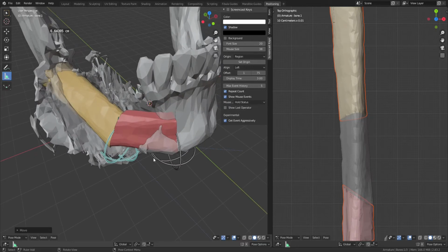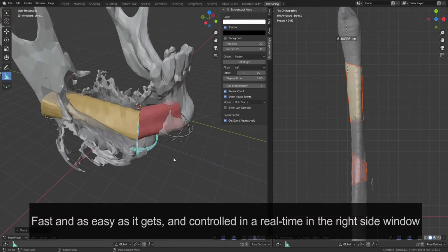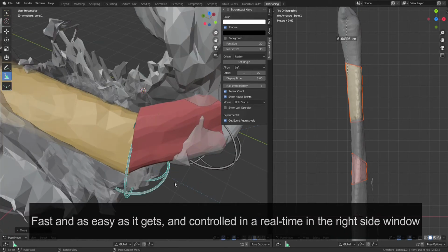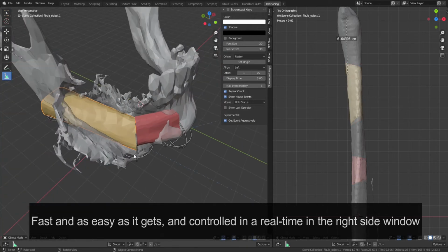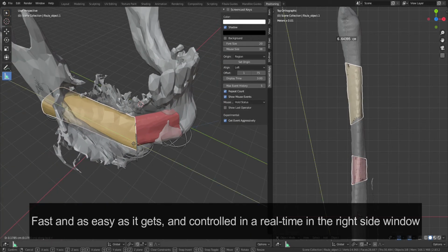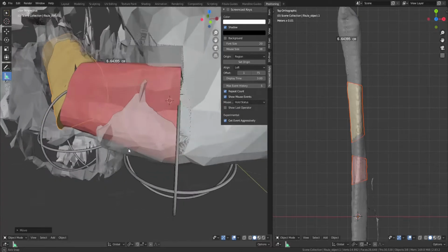You see, the change could be done pretty easily with just one click. Okay, again, we don't want to be too close. Yes, this is good.